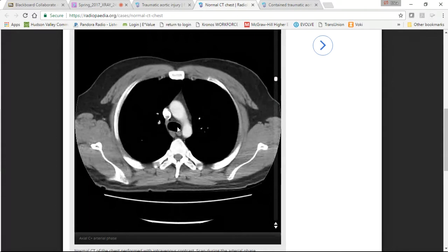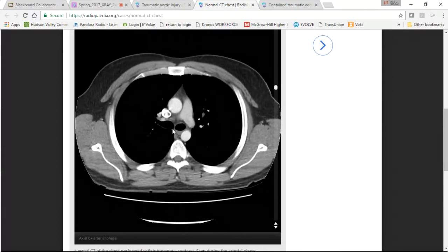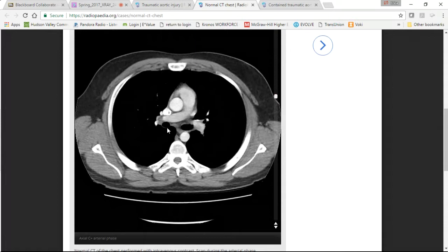The other thing I want to point out is, let me go back up. Here's trachea, branching, here's right main stem, left main stem. The first thing I want to show you is if I go one slice down, I want you to see how the left is starting to kind of go over. So if you can imagine, if I'm seeing it on a longer slice or an oblique kind of view, this branch is starting to go over transversely. It's moving over faster this way, so it's not as up and down. Whereas if you look at the right, it is still clearly up and down.